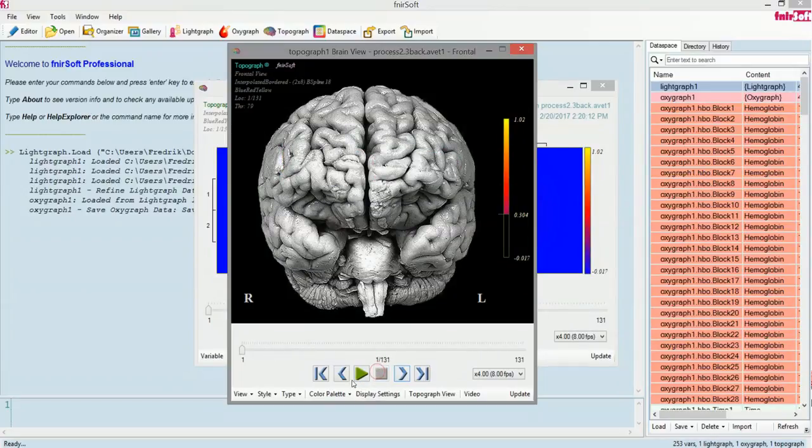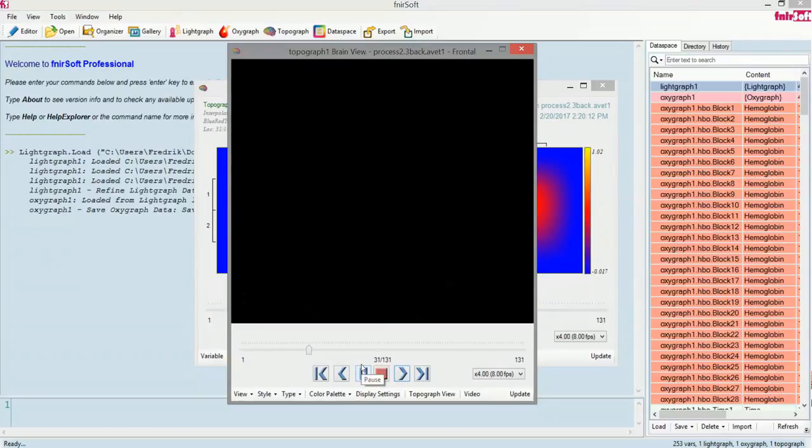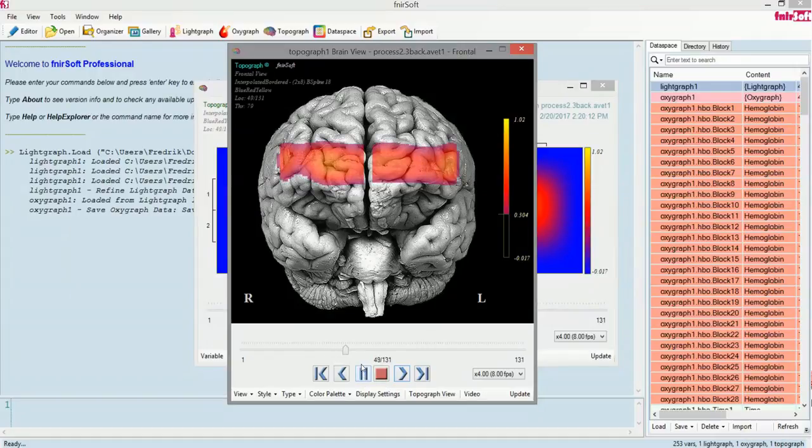I will restart it. So this represents the average process of the 3-back test, the average from 3 repeats of the experiment. So you see here, and if you were to repeat this video and compare the 3-back and the 2-back and the 1-back, you will see that the oxygenation level increases the higher the n-back level you get. Okay, that's it. So I'll stop there.